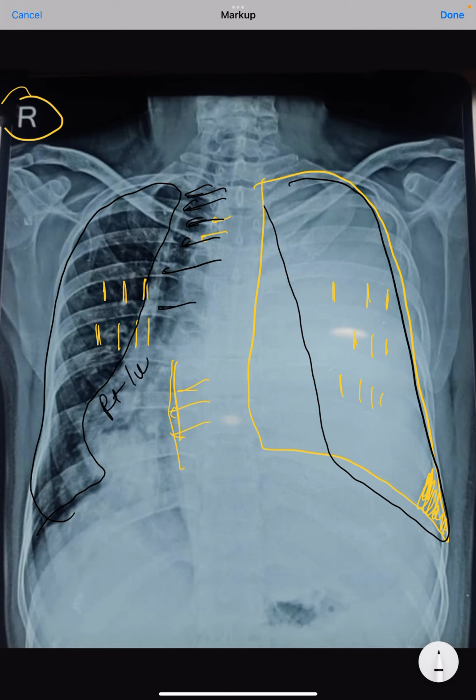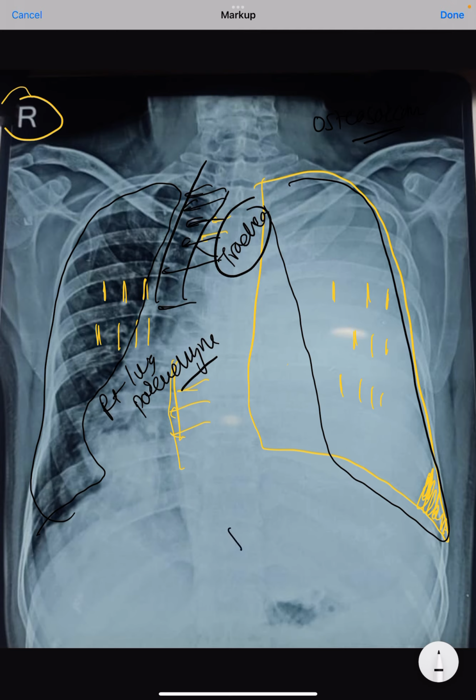of right lung parenchyma. So this is a very nice case, this particular case was having osteosarcoma of the leg, of the tibia, and this patient had malignant pleural effusion, gross pleural effusion, in which a pigtail was put to drain this gross pleural effusion.